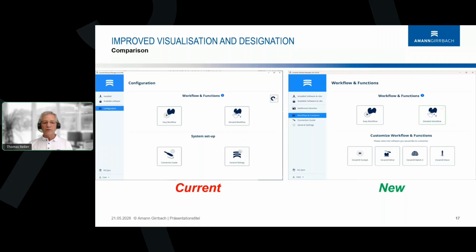So what did we do in the new area here on your right-hand side? We rearranged it a little bit so that you can find your site even faster. Important here are now the items that went to the left area, to the main menu area, and that means the main area is the first level.